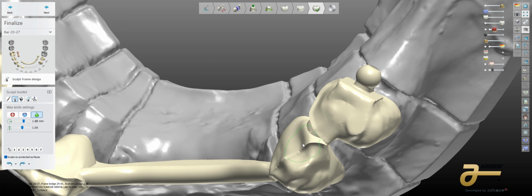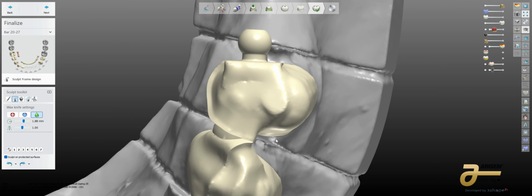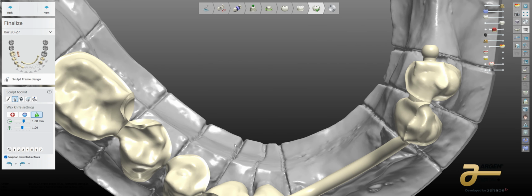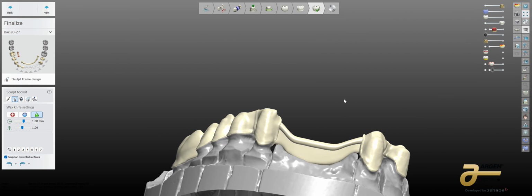But again, what it allows me to do is after I put the attachment in here, I want to maintain that square guide plane that's over here for this attachment. That is square to the top of this as well. This was all based upon my design, and square to the rest seat that's over here. So all three of those are going to draw together.